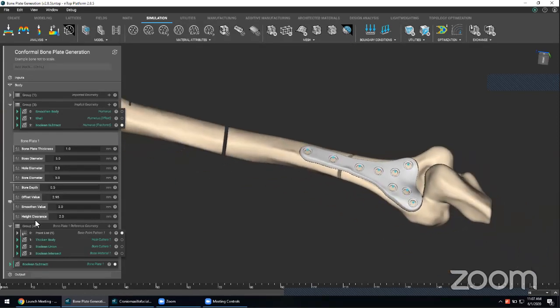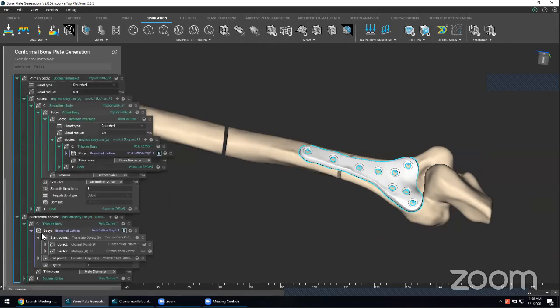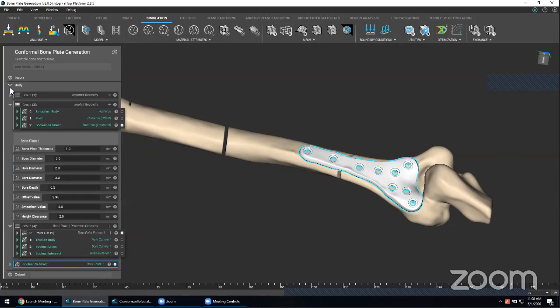Now over here on the left, we can see all these input parameters called out and this big expandable workflow right here that defines output geometry. If we open this up, we can see that this whole workflow has a lot going on and it can be tweaked and toyed with, right? But if we have a revision controlled process that we know works and shouldn't be modified beyond what we see right over here, I can actually bring in a compounded or a compressed version of this exact same workflow and use that instead.